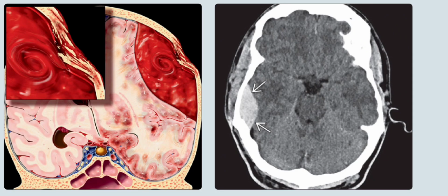So, this is a classic case of epidural hematoma. Left is the coronal graphic, which is showing the swirling acute hemorrhage from a laceration of the middle meningeal artery by an overlying skull fracture. The epidural hematoma seems to be displacing the dura inward as it expands.